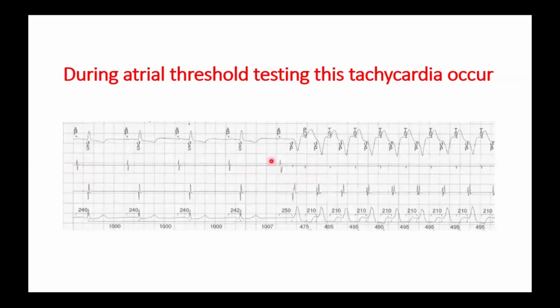Okay. Why did it occur here? What happened? What's wrong? Your answer is correct, but how can you explain it? Here is atrial pacing. You explain it.